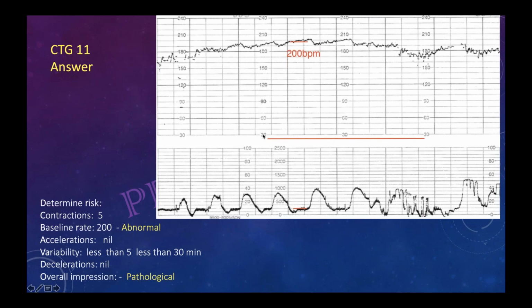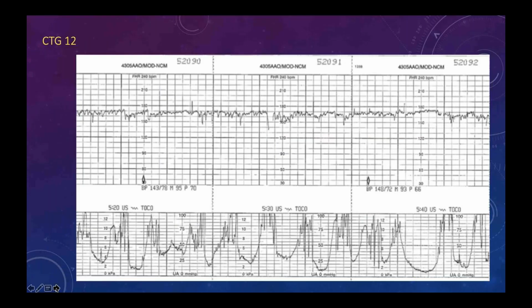The one which was discussed just now. Yes, this one, this is very difficult. From here to here, it will be 10 minutes. So you can count 1, 2, 3, 4.